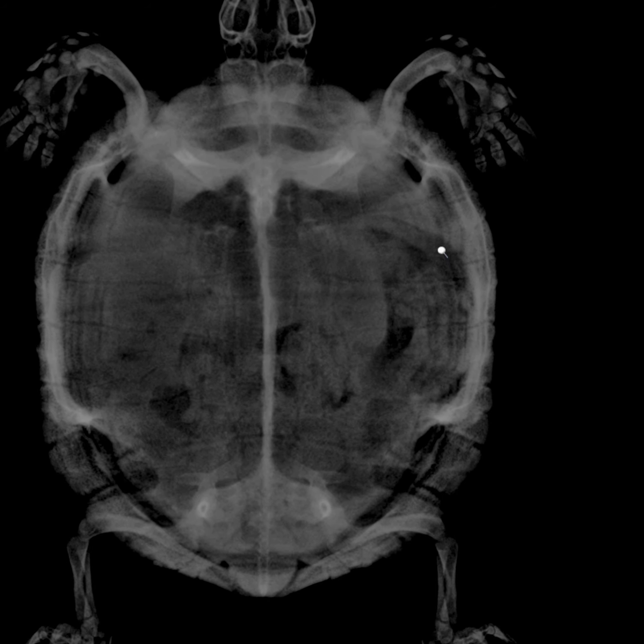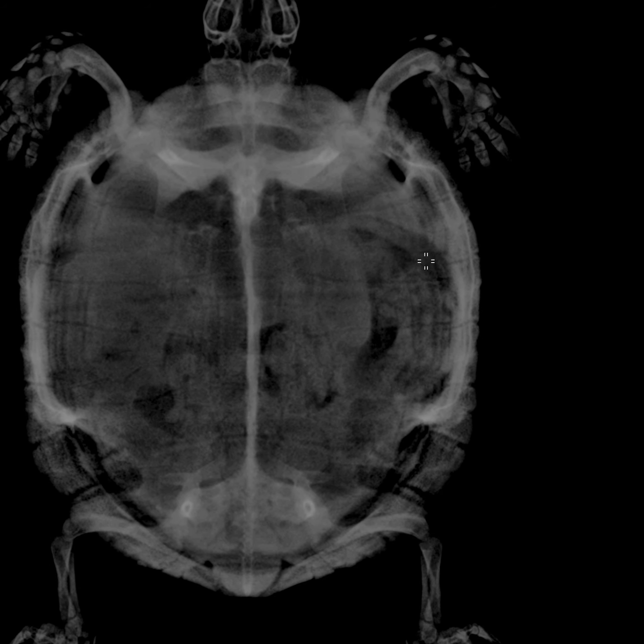So concluding in this case, the main abnormal finding is the stomach. So the stomach contains too much gas. So the two differentials are dysmotility or aerophagia. We can have aerophagia in an animal that is open mouth breathing. Regarding the content of the stomach, this could reflect dehydrated, inspissated ingesta, or it could reflect a foreign body.